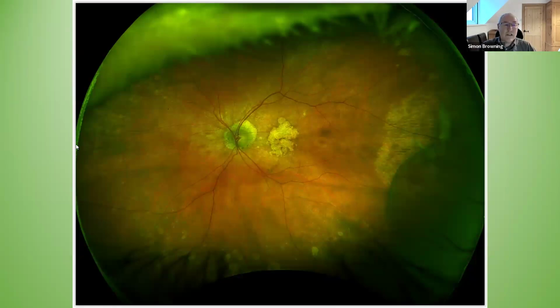You've got drusen in the periphery, you've got cobblestones, you've got paving stones, and you've got very large areas of paving stone degeneration here. And you've even, to boot, got a retinoschisis in there, which has been an acquired retinoschisis as a result of degeneration. Again, with all of this, it might look quite spectacular, but in actual fact, we're going to monitor that patient. You may change your mind when you look at the geographic atrophy here, but this is looking like a dry patient, so it's a monitor.